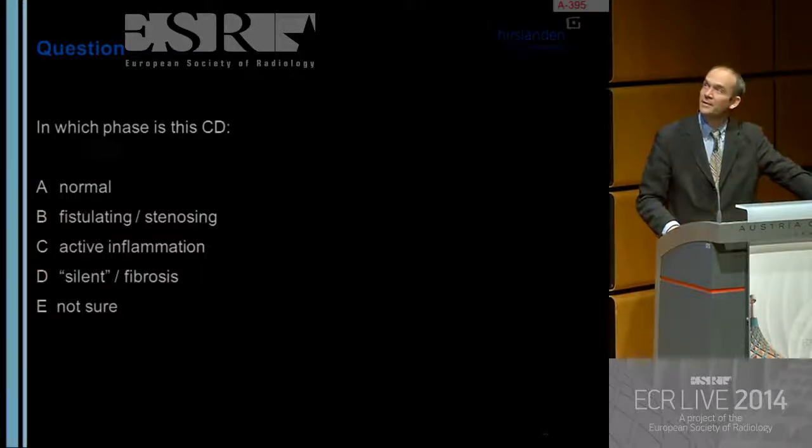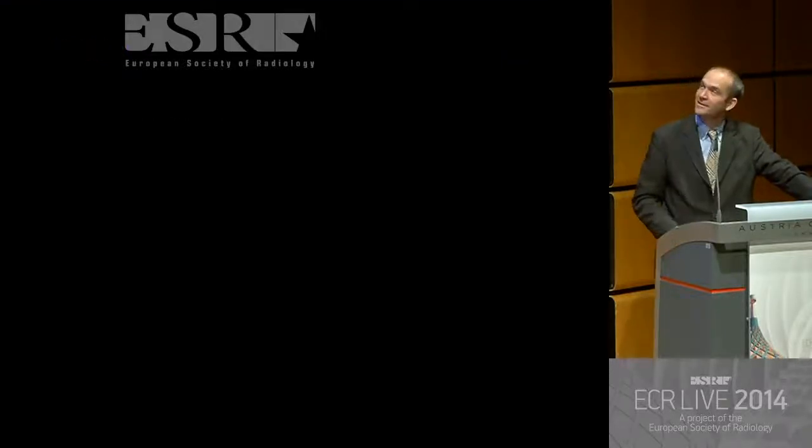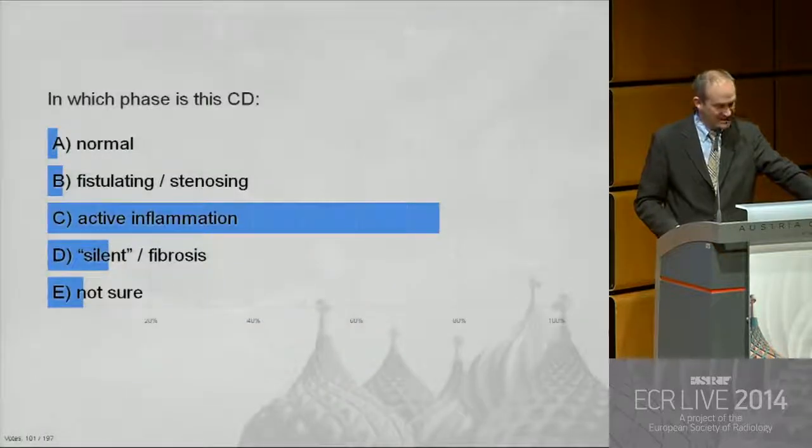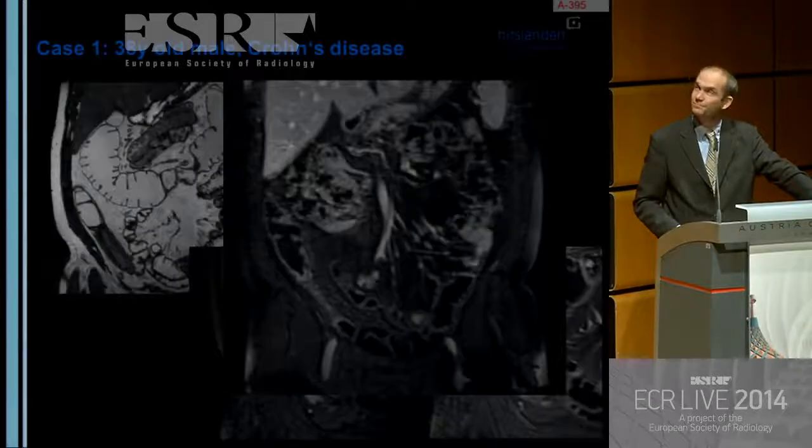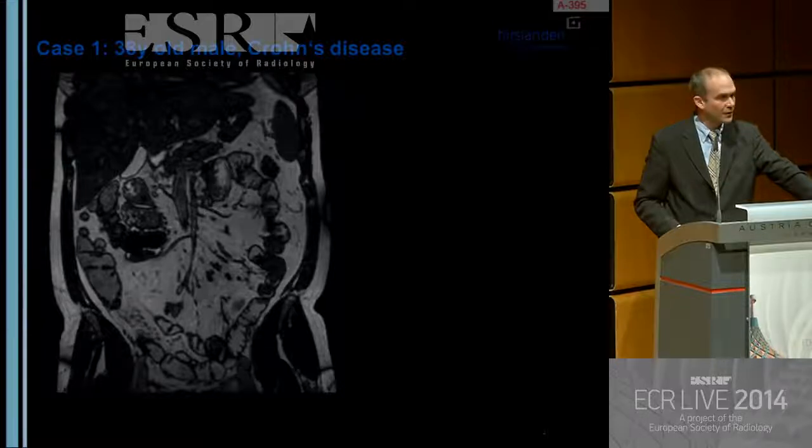So this would be the exam, how you... yes, so most of you passed. So it's active inflammation. But there's more to this case. Let's look further on. Same case.